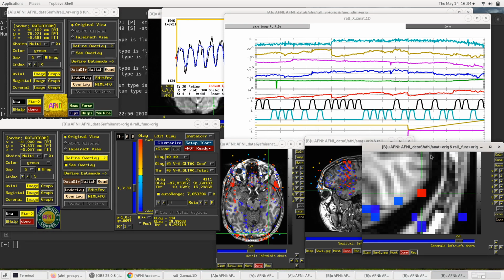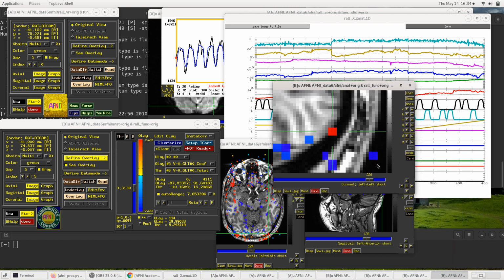And in the image window, there's this C button here. You can close the crosshairs to be very positive of which voxel you're looking at. One other small thing to note here is that there's a difference between the resolution of the underlay dataset and the resolution of the overlay dataset. So there may actually be an interpolation effect.